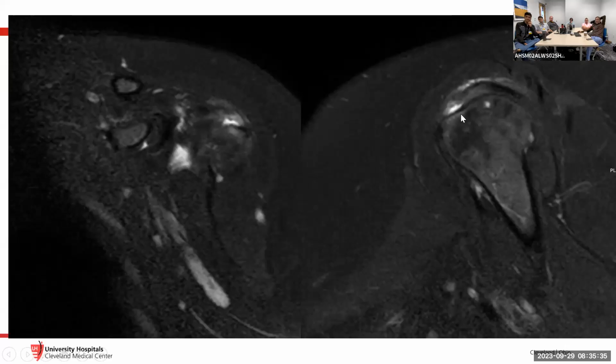So this is like a low grade or moderate grade articular surface tear of the far anterior insertional supra. This is our rim rent, so you can see a little bit of fluid signal intensity undermining the bursal sided fibers. Here's our footprint, and there's just some fluid signal intensity far anterior here. So this would be a low grade articular surface tear, far anterior insertional. And then if I were to measure it, I'd say it measures from here to here, probably 6 millimeters, superimposed upon mild tendinosis.